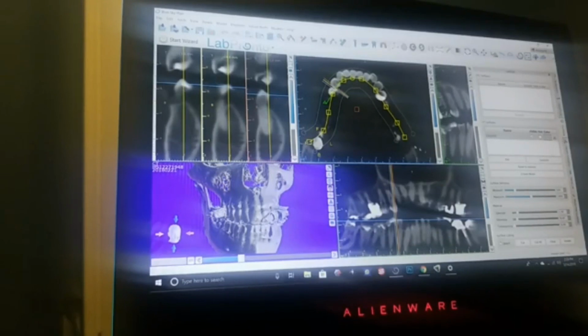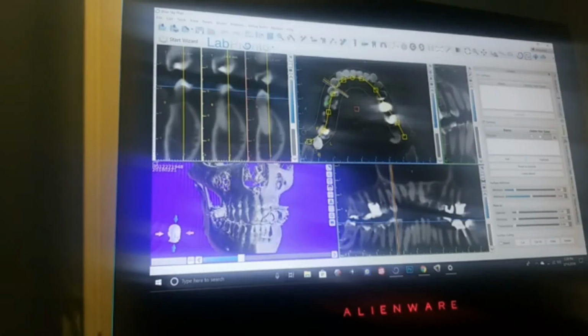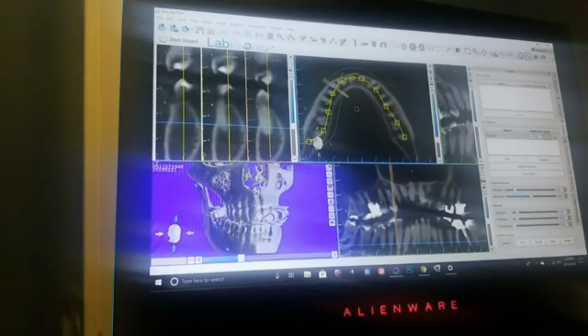So I know that I'm going apically. Now I can take it down. Now I'm clicking and it's going down. As I'm going down, I can look at the axial images. So if you want to see the entire axial images up and down, you can do that. Okay? You can do that.